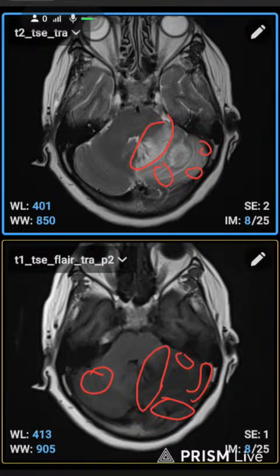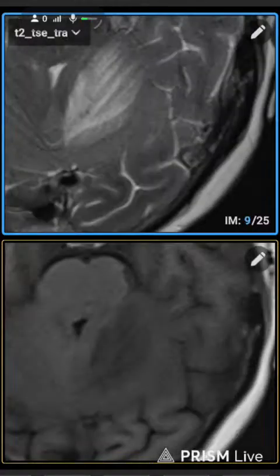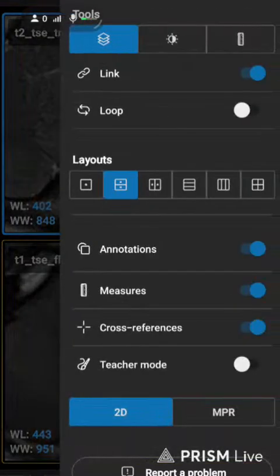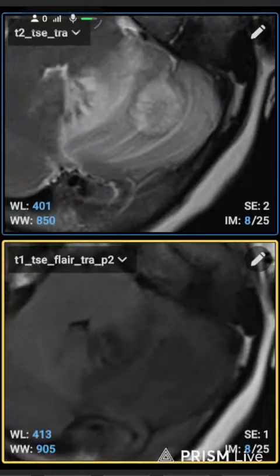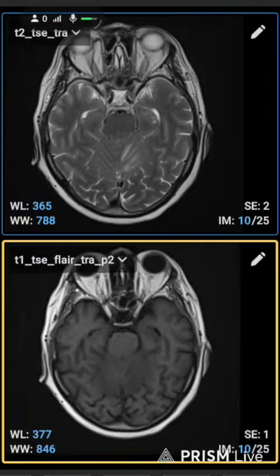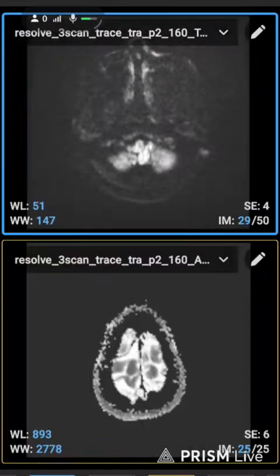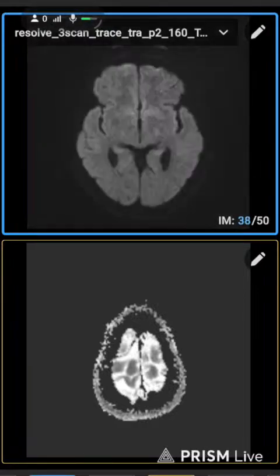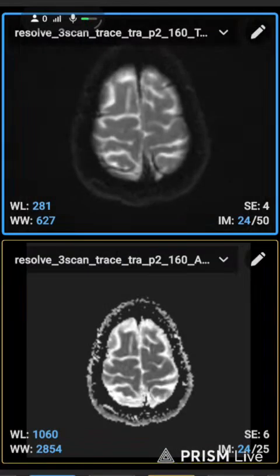So it properly indicates that there is edema, and if you look closely in this lesion, there is fluid. So in a plain scan you will identify lots of things. In MRI, it helps a lot if you have watched every sequence properly.